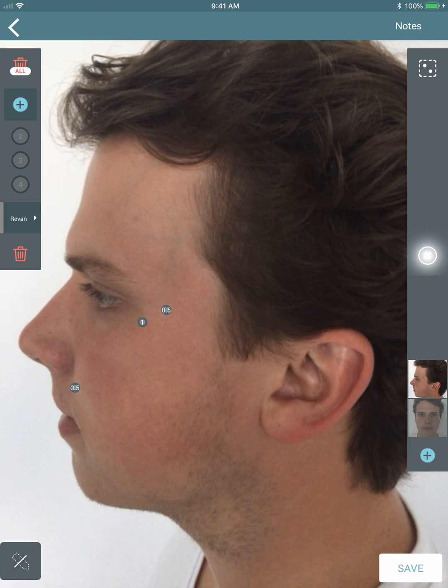Okay, so as you can see, we have 1 cc, a half cc, and a half cc. That is a new injection point because I pulled it out from the plus sign. However, point number 2 does not double count the dosage.